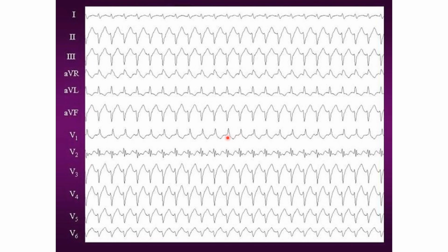Here the QRS does not appear so wide as in other leads, probably because a part of the QRS is isoelectric. You can see here probably a little bit of QRS is isoelectric. That's why here it would appear like a narrow QRS tachycardia. Then no obvious P waves are seen to say whether it is a supraventricular rhythm or ventricular rhythm.